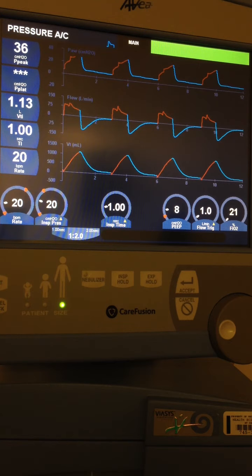it measures the inspiratory flow initially in that first breath, and then when the pressure control breath is delivered, if it hasn't reached that volume that we have specified, the machine will transition to a continuous flow until the volume has been delivered. Now, it won't trigger into exhalation until it reaches that volume. But remember, we have a set I time, so that flow is adjusted based on our I time setting to get us to the machine volume limit that we have put in.